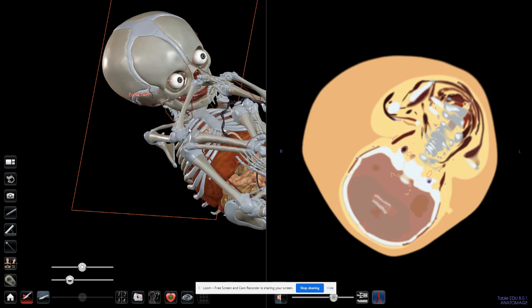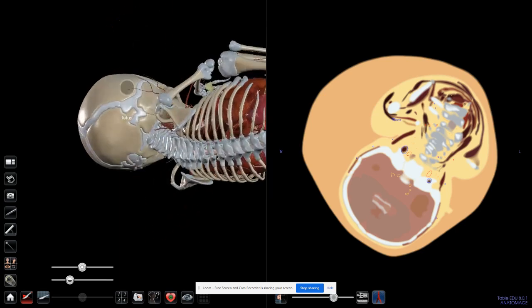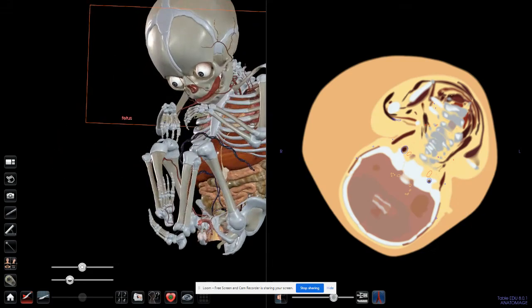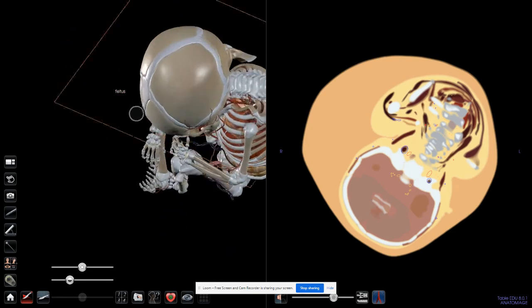Or you can write. Will this follow my rotation? Would it be pinned if I write on the structure that I have? No, as you can see. What would be pinned to the exact structure that I want?